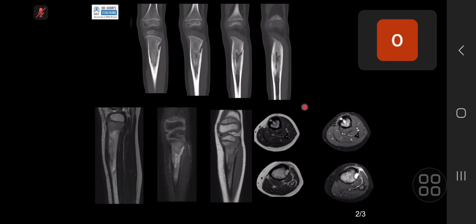On CT scan, I can see a central lucent lesion with surrounding bony sclerosis and a defect coursing cranially, in keeping with cloaca.